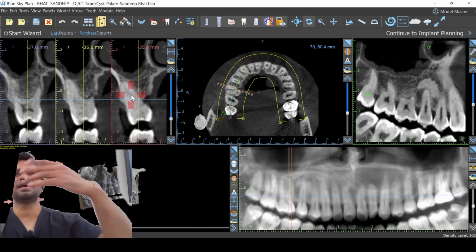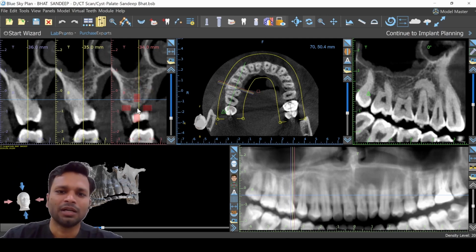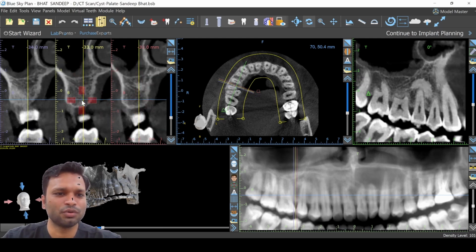Okay, it is not necessary to see all the things in one slide. Okay, now as we move further ahead, another point you remember: this view that is visible, if I move further, this view shifts here. So you don't have to look at all three views, just keep your eye on the center view and keep in mind that this is the yellow line. That is more than enough.